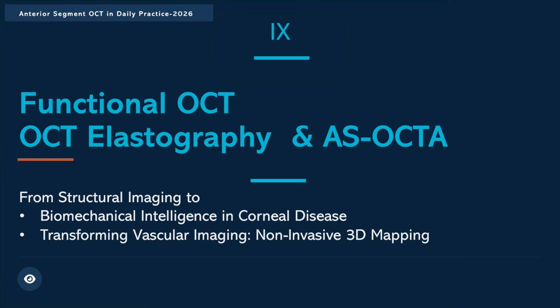Now we will shift to another dimension in our discussion about the clinical application of anterior segment OCT, to the use of what's known as functional OCT. By functional OCT, we not only assess the structure, as in standard OCT, but we assess the function of the structure, like the OCT elastography.